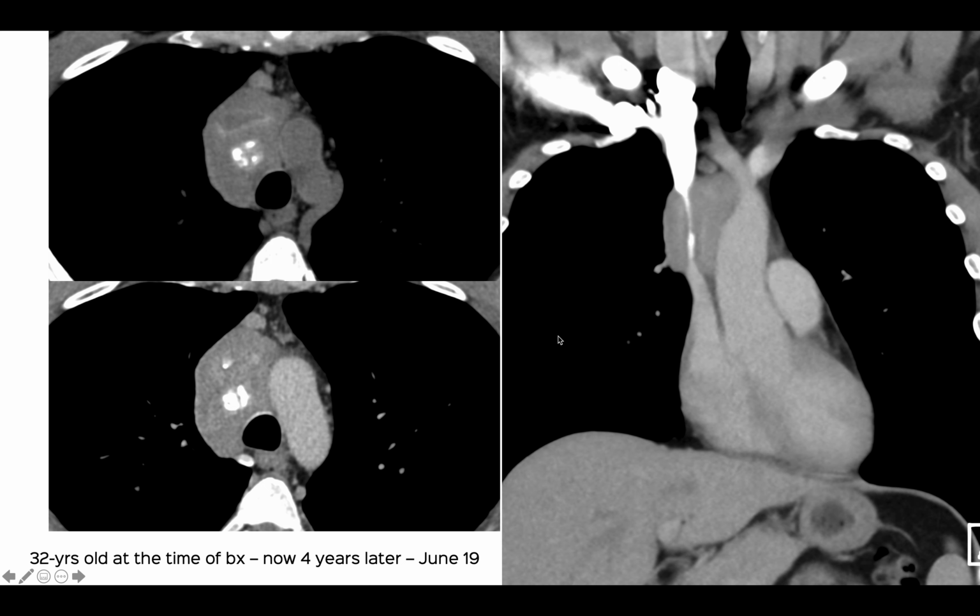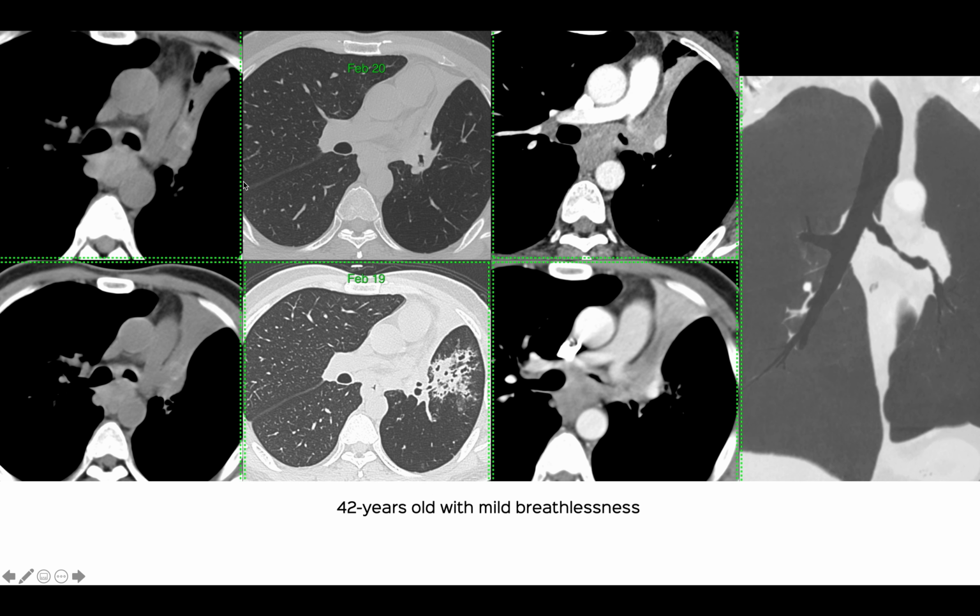And here's another patient. I biopsied this patient in June 2016, and I don't have the images from there, but sorry, it was 2015. And 4 years later, we can see that the SVC continues to be narrowed. The lesion shows minimal enhancement. While it's not completely hyperdense on the plain scan, there's a lot of calcific foci here. And when I was biopsying this lesion, it was hard. And I'd used an 18 gauge at that time to do it, and the diagnosis had just been non-specific fibrosis.